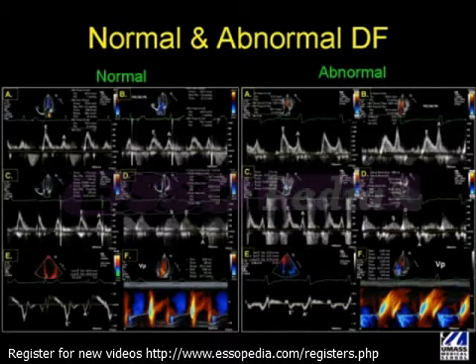But if you look just to the right in panel B, in both the normal and abnormal, you see in the normal example, as we reduce preload, both the E and A proportionally decrease. However, there is some increase in the deceleration time with little change in the A wave. But off to the right, you see the E wave comes down significantly and inverts the E and A ratio. The deceleration time increases and the A wave increases. That A wave increase is most likely, I think, a product of increased deceleration time with more atrial filling, hence more atrial contraction and more loading into the ventricle at end diastole.